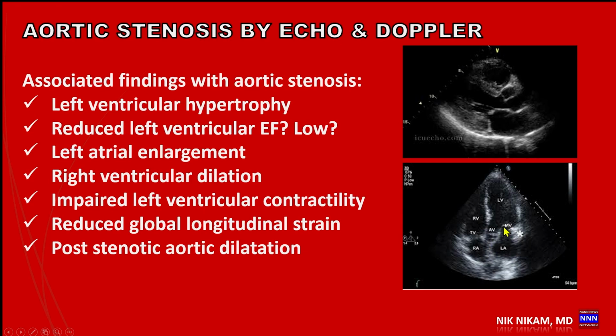Again, we can measure the left atrial size and note that there may be evidence of calcification. All of these things may account for the degree or severity of aortic stenosis. Again, calcification of the aortic leaflets is also an important factor, and it will be used in determining the degree of aortic stenosis in patients with low cardiac output. And this can be done either by echocardiography or more specifically using a cardiac CT, which will detect the presence of calcium on the aortic leaflets.